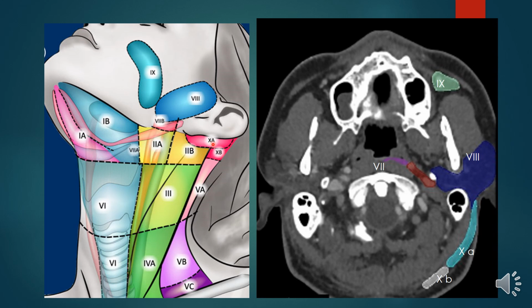So here we are above the level of mandible. We have come up, and in this slide, above the level of mandible, what we see are the parotid lymph nodes, level 8, at the level of parotid gland in the parotid space, 9 anteriorly at the buccofacial region, and 10A posteriorly, that is retroauricular, and 10B, the occipital. So 10A, 10B, 8 and 9. And as I told you earlier, this level 7 lymph node, which is retropharyngeal in location along the entire length, can be seen only on CT or MRI. Any lymph node in this space will be level 7, from the level of mandible up to the level of clavicle. Entire length will be level 7. And this is 8, 9 and 10A and 10B.